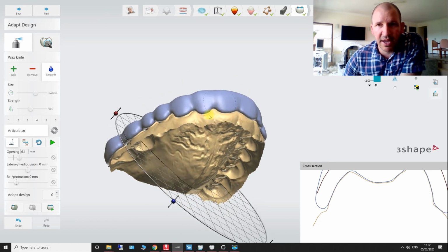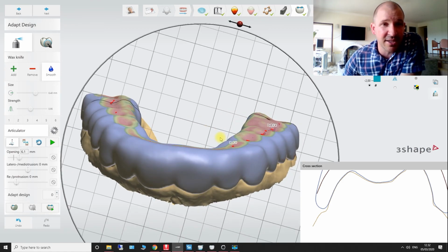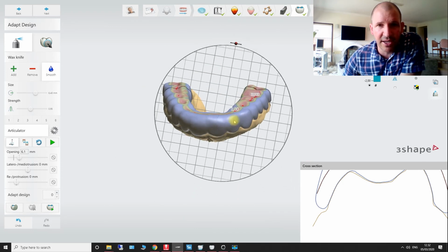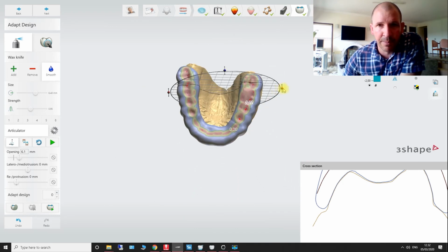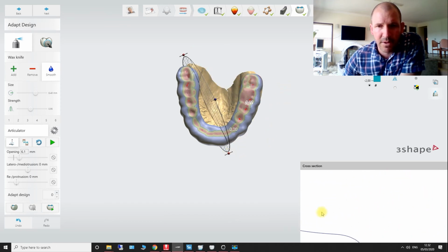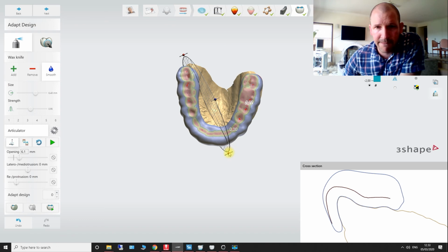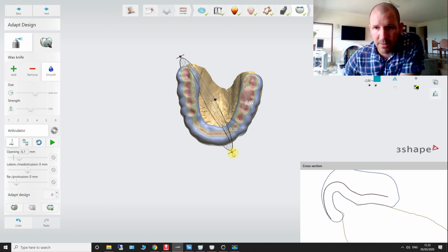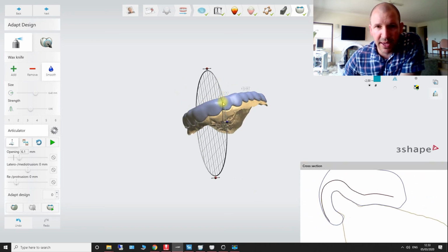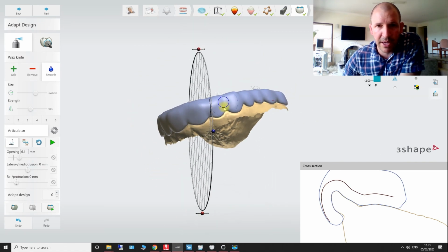So hopefully that helps you guys out with the design, and let me know how that splint that I sent over fit. I imagine it's going to be a little bit tight, especially the area that I think it's going to be tight is most probably going to be more so these areas, somewhere around this area here of the 2. Right there, that area there, I think is going to be the tight undercut area. So that might be one area in there that I might be looking to maybe trim a little bit.